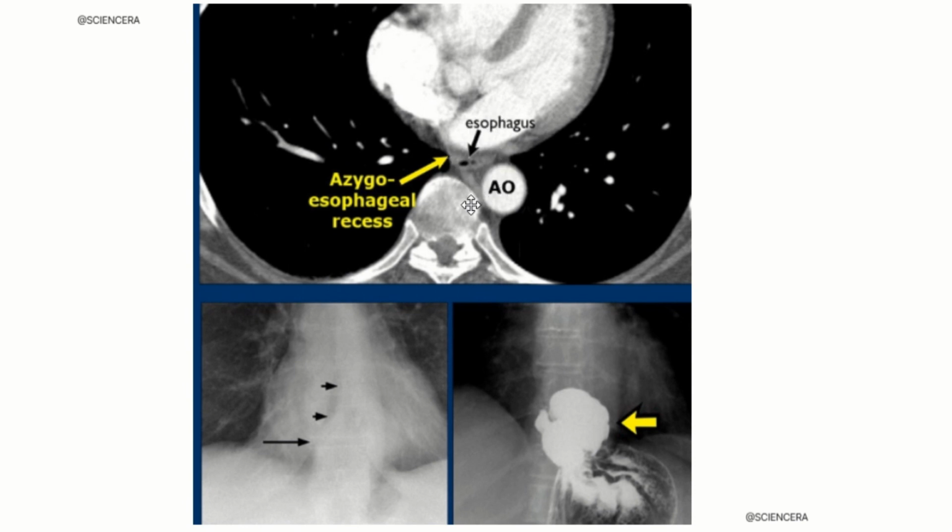Now sometimes doctors look at a chest X-ray and notice that the line where the azygoesophageal space meets the lungs and other structures is not in its usual place. This happens due to four to five reasons, which are very common. Number one reason is a hiatal hernia. You can see here the yellow arrow indicates a hiatal hernia. This is when a part of the stomach pushes through the diaphragm into the chest cavity, which can affect the position of nearby structures like your esophagus.